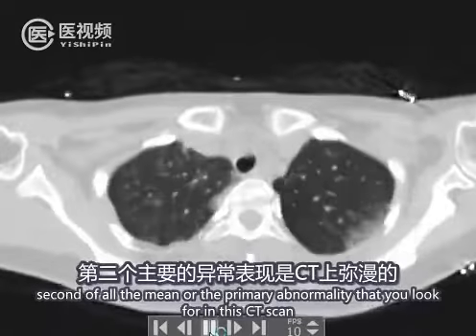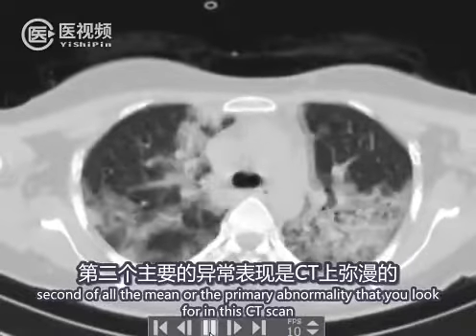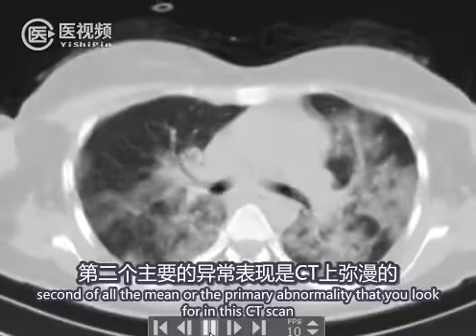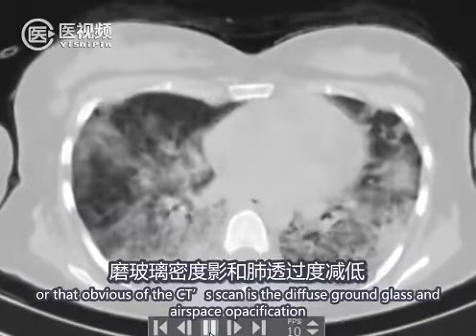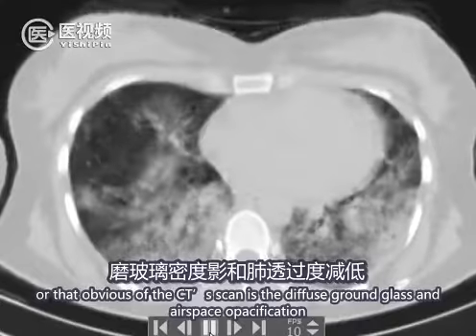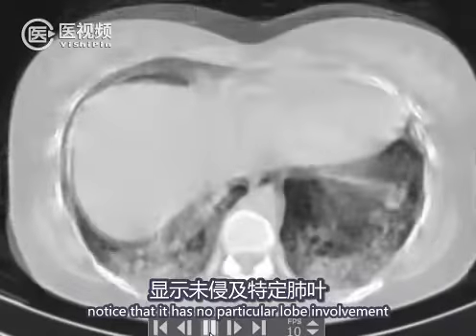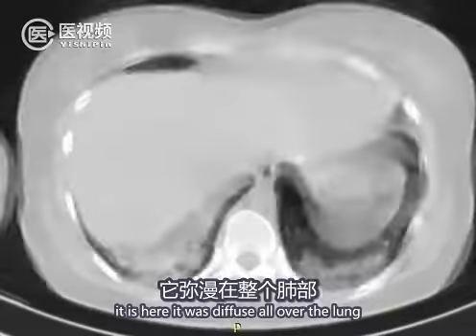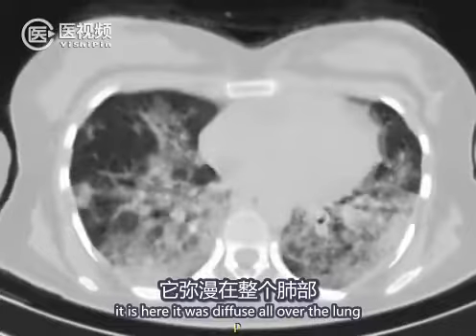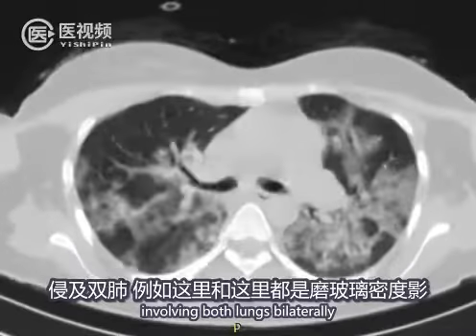Second of all, the primary abnormality that is obvious in this CT scan is the diffuse ground glass and airspace opacification. Notice that it has no particular lobe involvement. Here it was diffuse all over the lung, involving both lungs bilaterally.